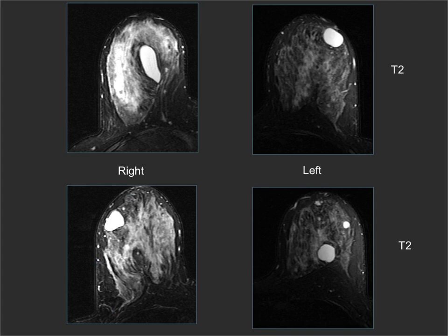And when we look at the T2 signal in her, she has high T2 signal with macroscopic cysts throughout both breasts, and so we just call this benign fibrocystic change. Now, should this patient continue to have breast MR screening? Well, one could debate that our sensitivity is low, but it doesn't mean that now we've got a baseline, we'll not be able to pick up a cancer at some point.